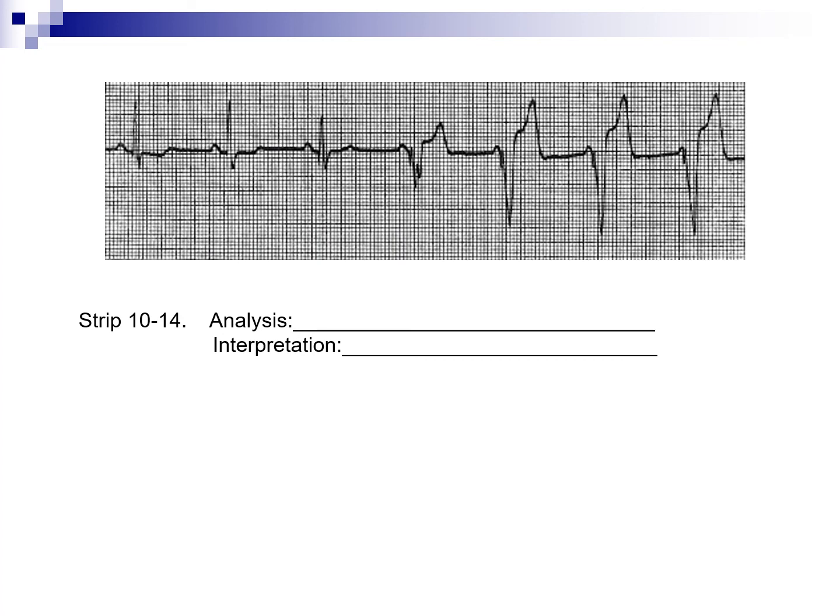In this rhythm, 10-14, if you look at how fast your pacer is going, it's going at about 60, okay? So what you do have is the patient's own beats, intrinsic rhythm going. Then you have a fusion beat, which is basically the patient's own rhythm trying to come in, at the same time that the pacer is sensing that there was no patient rhythm and trying to fire at the same time.